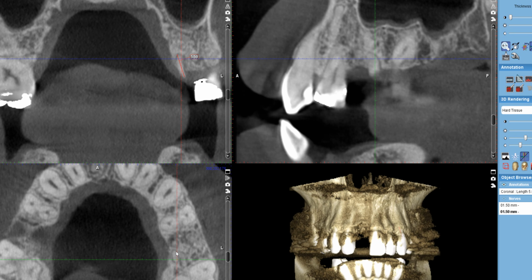And remember that it had the endodontic filling material that's going all the way to the apex of a single root, whereas there was a part of the filling material extruding or extending into the side of the root, and we had a hard time visualizing where it was going. It's very possible that the filling material was partly filling in the palatal root.